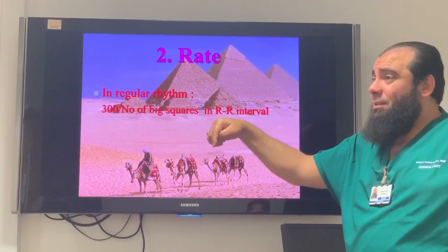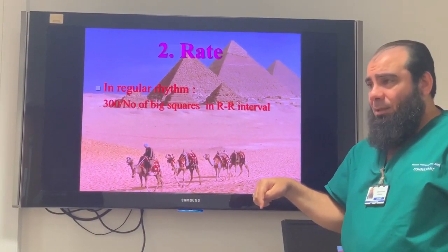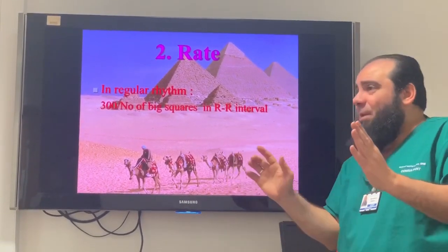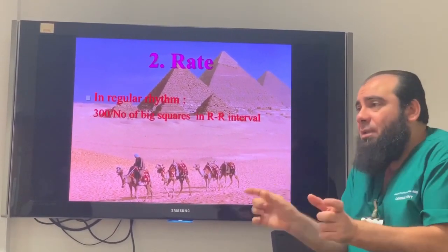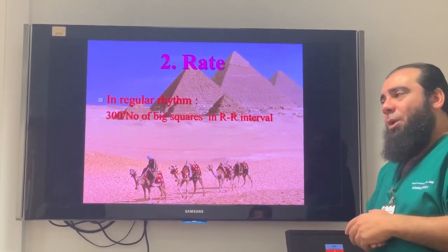Is it always like that? So it's a bit difficult, isn't it? It is easy if I can adjust it in some leads, but sometimes it's not possible. It gives some tiny squares here, tiny squares there, some big squares in between. It's happening. Any other way to calculate? Anyone knows?